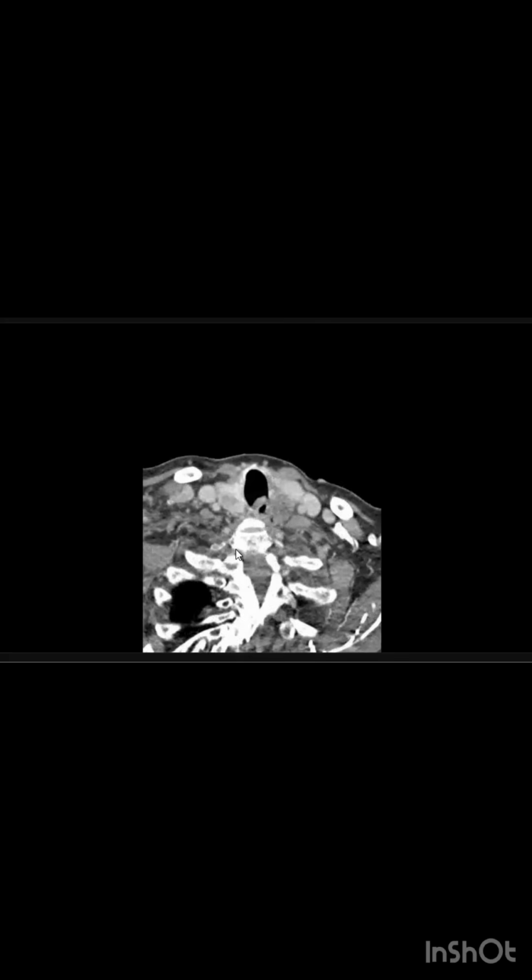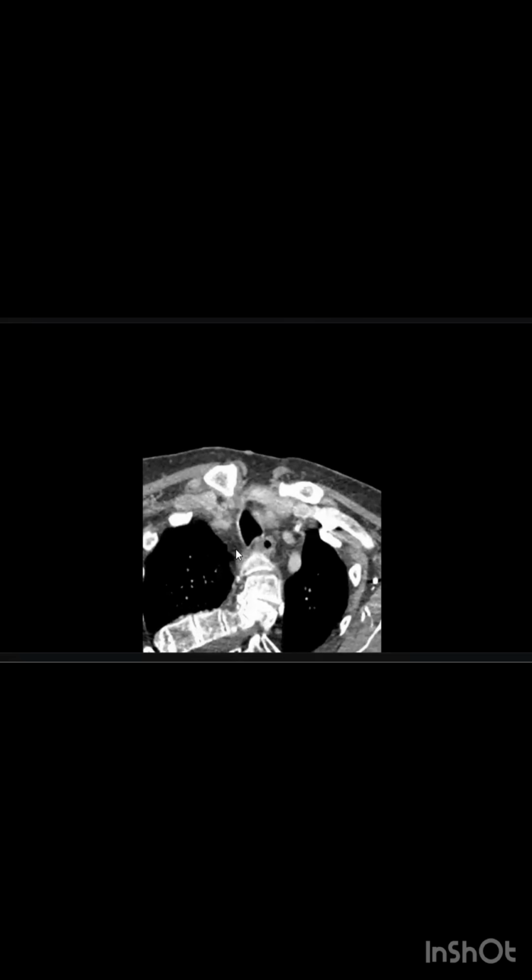If you face in the exam a plain radiograph of the chest and you find marked scoliosis in young patients, you have to put NF1 as a differential for your case. We did confirm the diagnosis by oral contrast. The differential for this case is Zenker diverticulum along the Killian dehiscence, but Zenker will be posterior.